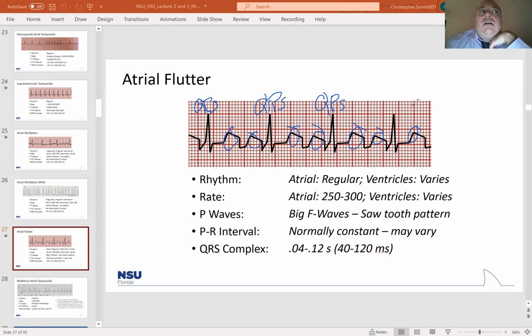Normally, ventricles repolarizing uses a little bit of electricity. But in the case of the atria fluttering, that's going to generate more amplitude than the T wave does. So the T wave is going to get buried behind the flutter wave. It's still happening, things are still repolarizing. You're just not seeing it. So what happens in a flutter is generally you just don't see your T waves.